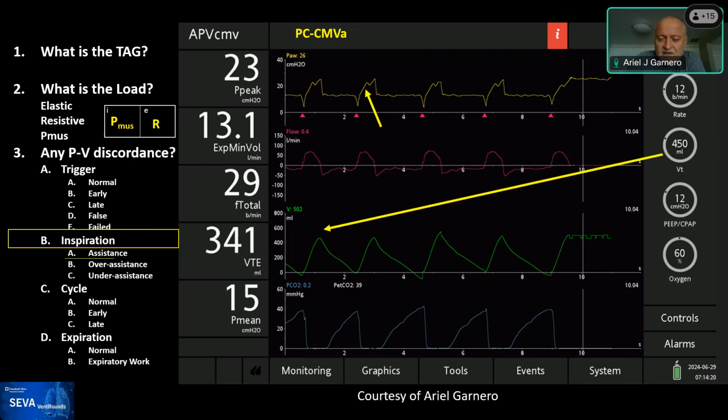Yeah, it's pretty much what they are saying. A question: the difference between the ideal pressure waveform and this one that has a little delay in the rise, does that mean that there might be some work shifting or the vent is not pressurizing properly? Well, first of all, we see a slope on this pressure rise, right? And I do believe on this ventilator, you can set an inspiratory pressure rise. Is that right, Ari? Yes, it is.